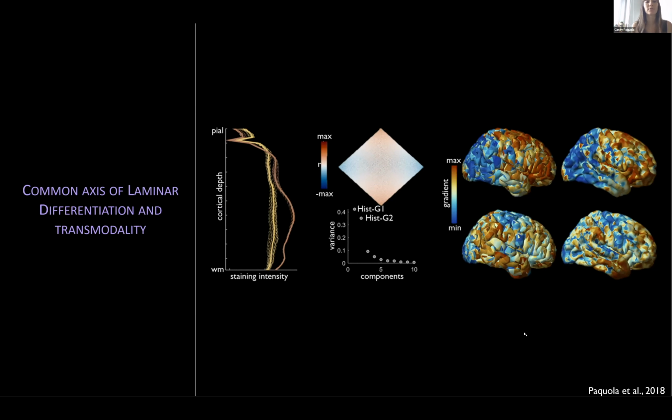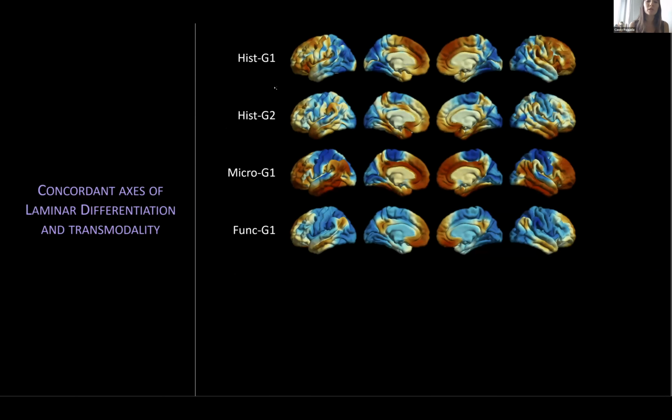Here we have these first two gradients. We've employed a little bit of smoothing here as well, because we're using nearest neighbor interpolation. Then we smooth on the surface as a way to almost artificially use something like a trilinear interpolation. But we can also test with and without smoothing and get quite similar results, actually.